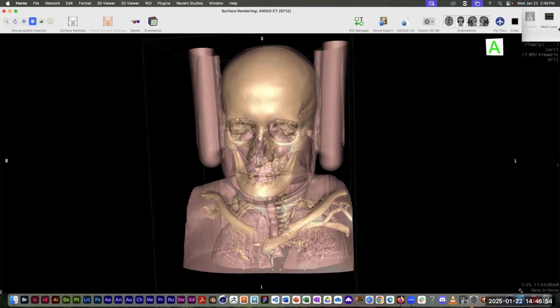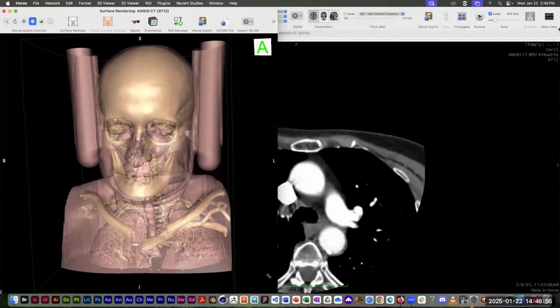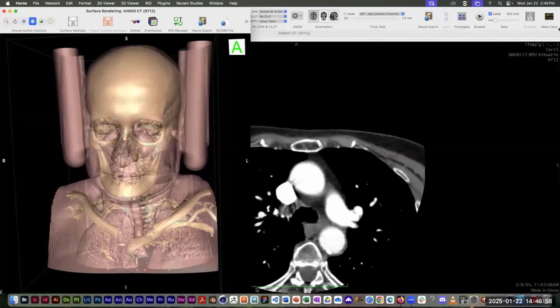I'm going to actually grab the window by the bottom right and just drag the sides of the window in, so I'm not getting so much black space on the sides. If I had left the window the full width of the screen and I exported a JPEG, it would just give me all that excess black on the sides, which isn't really a big deal.